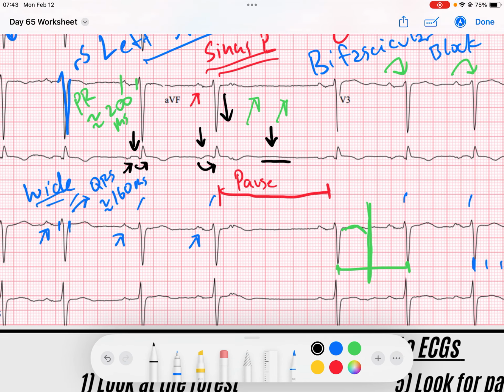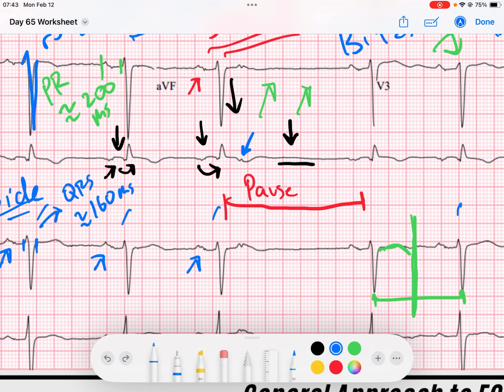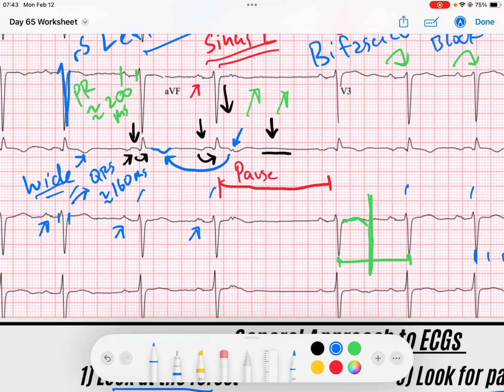And so what I see is this little itty bitty notch on that T wave. It is very subtle, that little notch on the T wave. And if you compare that to the previous T waves, in the previous T waves, it doesn't happen. The T waves are usually really slopey and gradual. P waves are usually very sharp. Atrial depolarization is very sharp. And if you look through other leads in the same distribution, you can see this sharp deflection on that one that is not on this one.